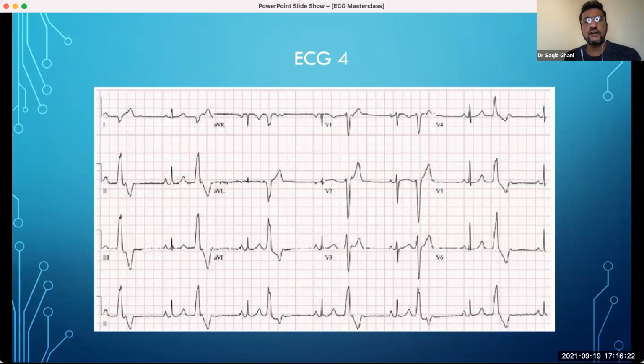Anyone would like to have a shout as to what they're looking at? Ventricular bigeminy. Okay, good call. What you're saying is ectopic beats. Yeah, ventricular ectopics. So let me point out these ones with P, QRS, and T are normal rhythms.